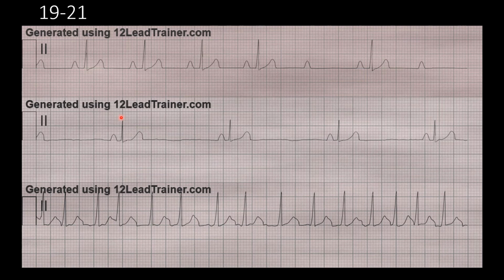We do have P waves. There is one before every QRS, but there's also an extra one right here. So with that, they do look like they're coming from the same pacemaker. They're monomorphic, upright, round, and lead 2.